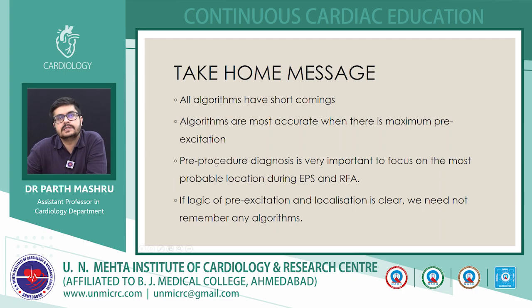Next, pre-procedure diagnosis is very important to focus on the most probable location. So it's very easy to actually go and map that area if you know the pre-procedure diagnosis of the pathway. Also the risk associated with ablation. If the pathway is near the His, you know the risk of CHB beforehand, before taking the patient inside the OT. So that's why it is very important to accurately diagnose or accurately localize the pathway.